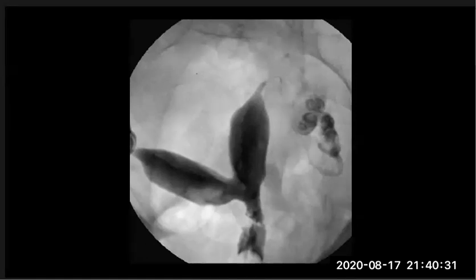We cannot differentiate, by the way. So MRI is the next step for this patient. Here, the hysterosalpingogram shows two horns. One differential diagnosis is bicornuate uterus, the other is septate uterus, and the next step is MRI.